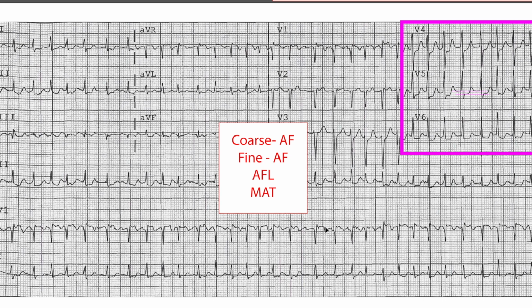You would need those breaks. These breaks are golden. When you're talking about fibrillatory or chaotic rhythms, make sure you do yourself a favor and you find these breaks. You look for these breaks. This is a small one. And this one also kind of cancels out atrial flutter for me. I'm just not seeing the pattern that I was expecting. So we're left with fine and coarse atrial fibrillation.